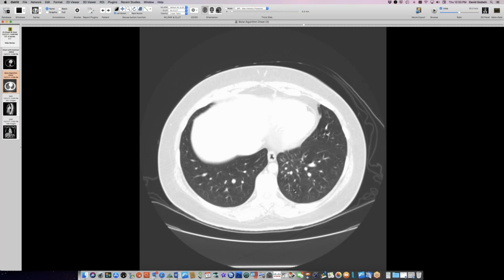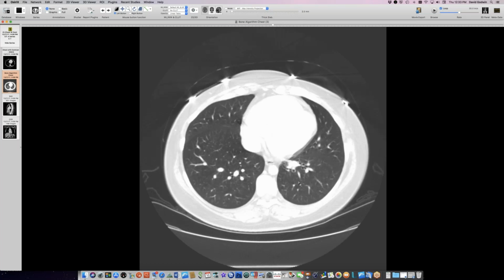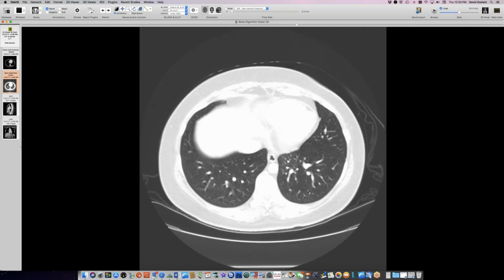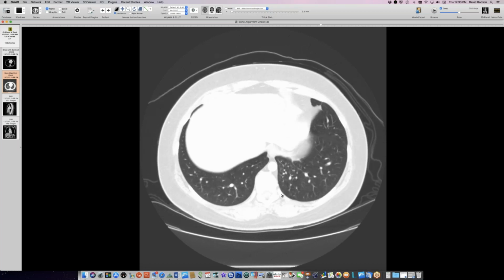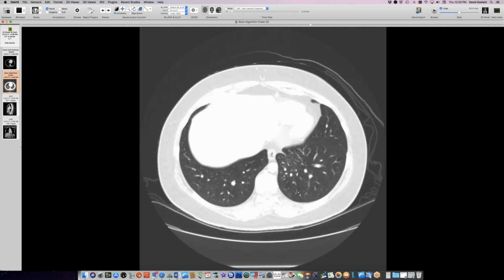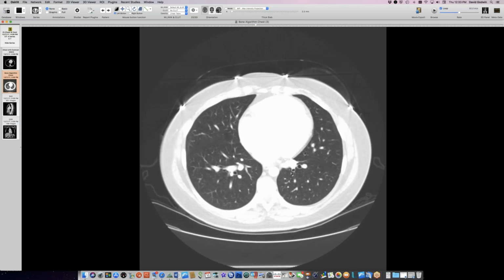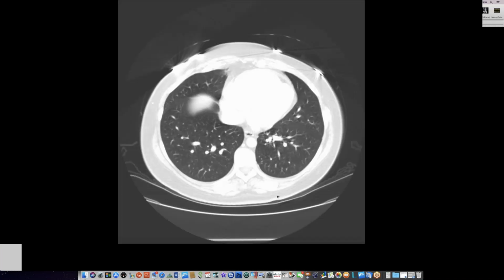It's sequestered from the normal airway connections. This person has robust airway connections in this part of the lung. Matter of fact, maybe there are too many of them. I mean, that seems like a lot of little bronchi. But at any rate, it's not a sequestration. So this is systemic arterial supply to the left lower lobe, but not sequestration. And I think we're seeing extra lung vessels here because of the higher pressure that's driving the perfusion down there. And I don't see any abnormal veins here, so this is probably draining to normal inferior pulmonary veins per usual. So it's not an AVM, and it's not sequestration, it's systemic arterial supply to the lung base.